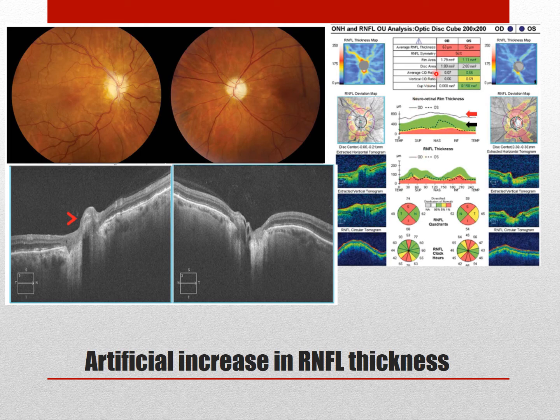Yeah, and let's look at the optic disc. You see here, the optic cup size is not normal for the disc size of 1.8. This is really small. Yeah, there's something not right.